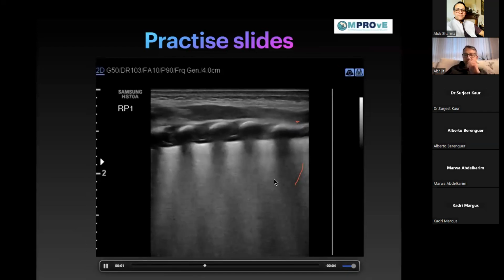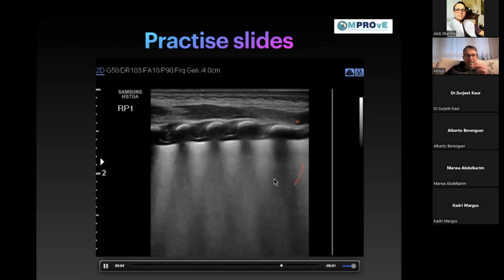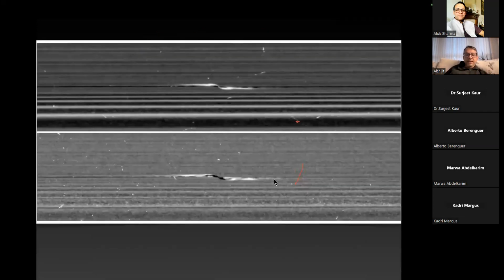Right. So again, I will not trick you with this one. This is again another homogeneous picture, which you see in RDS. What about this one, guys?